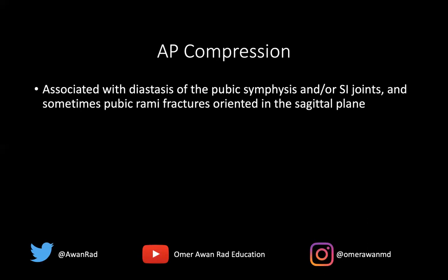Now, the important thing is that in the index case, there were no pubic rami fractures, but if there are pubic rami fractures, they're oriented in the sagittal plane. Typically, on an AP radiograph of the pelvis, they're going to be vertically oriented pubic rami fractures. Very important when we consider the type or mechanism of injury.